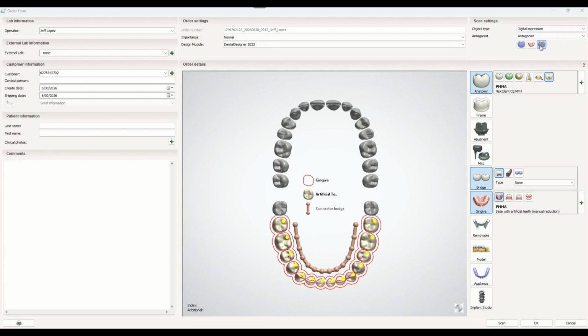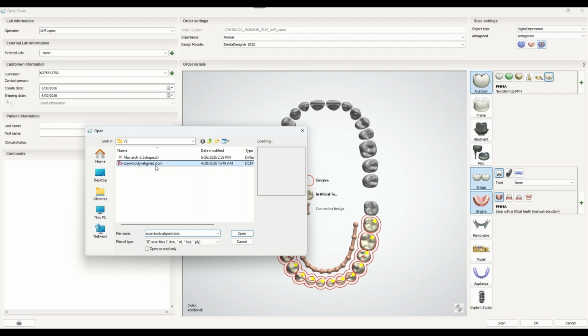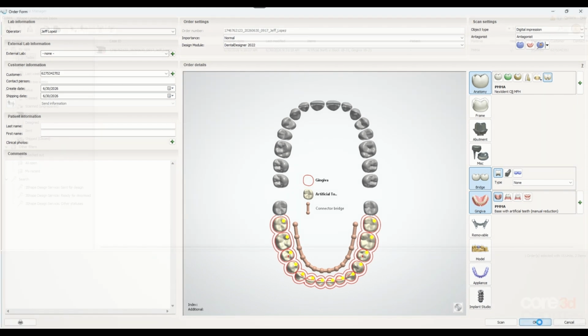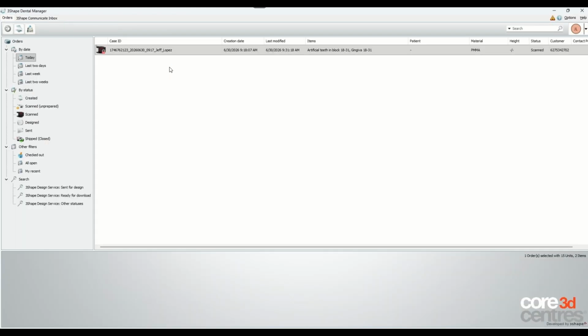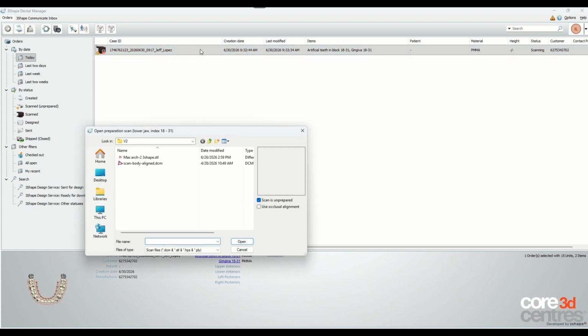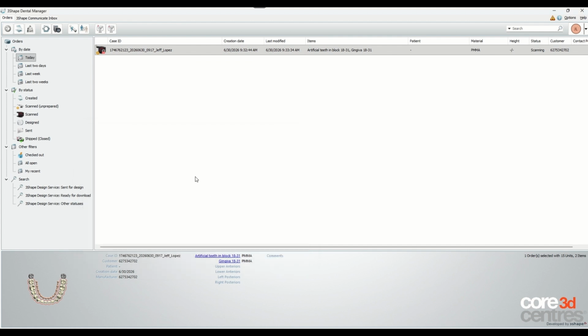If using PreatLoc angle abutments, select the Add Additional Scan button below and add the arch scan with the scan bodies present. Then select OK and start the case. On the next screen, right-click and select Import Scans. Then import your implant level scan for the arches you will be designing dentures for, a bite scan, and an antagonist in the case of single arch cases.